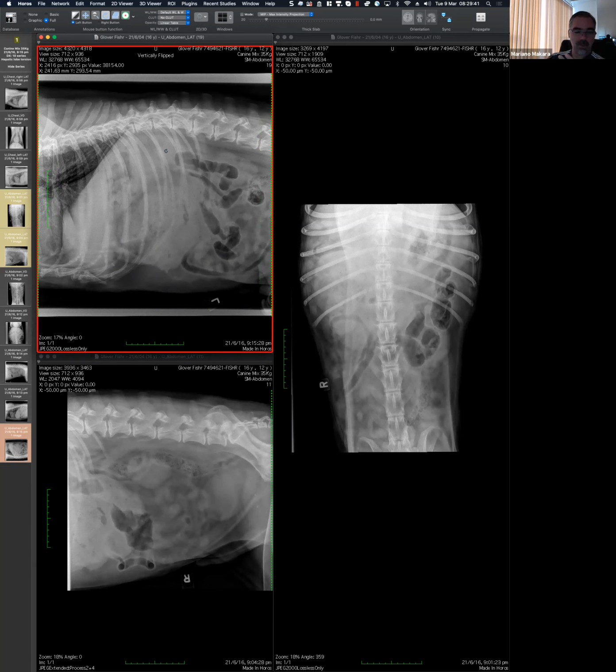And probably, Ross, if you're around, if I were an examiner, I would be playing with that idea. This candidate knows how to radiographically rule out free gas. It's very simple, super useful, takes 1 minute, super cheap, and it's something that we need to know. Makes sense? So it's easy to miss.